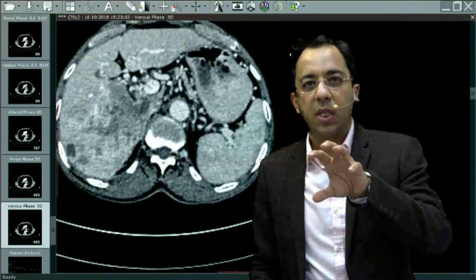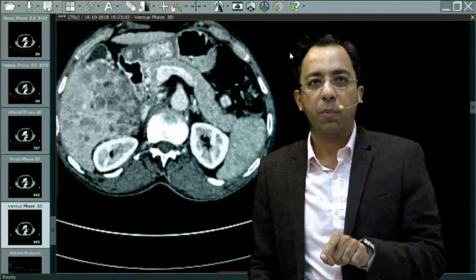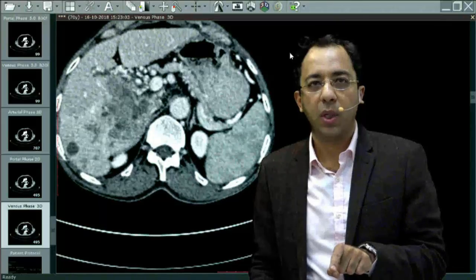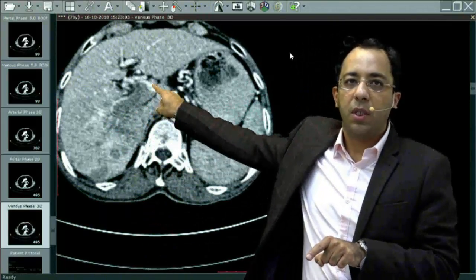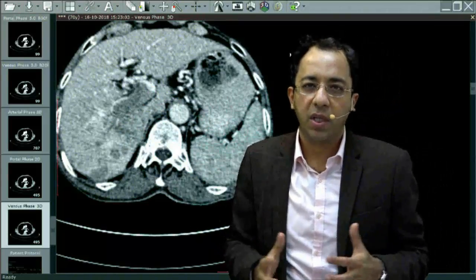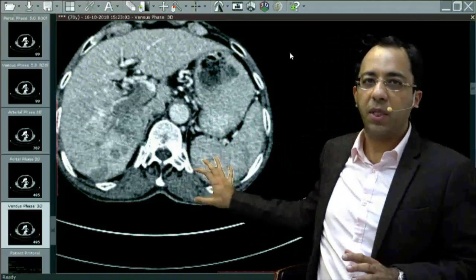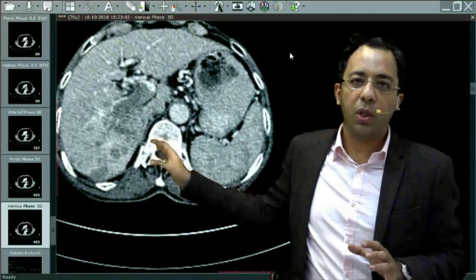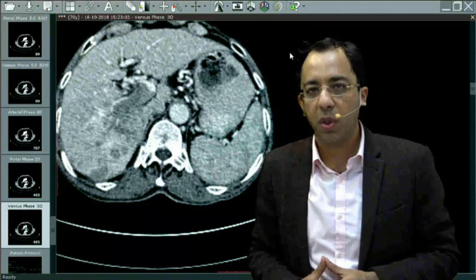And now let's trace, if you're a resident, let's look at the pancreas with me and look at the portal vein, and you will see the thrombus. Okay, don't worry, you will see it. And now here you see it. Can you see this? And this is how a typical exam case of a resident would be. But if I have to show it to an undergrad, it would be a single image. They will show you a liver lesion, a portal vein invasion, and ask what do you think this is? When you see such an appearance, the first thing that should come to your mind should be hepatocellular cancer.